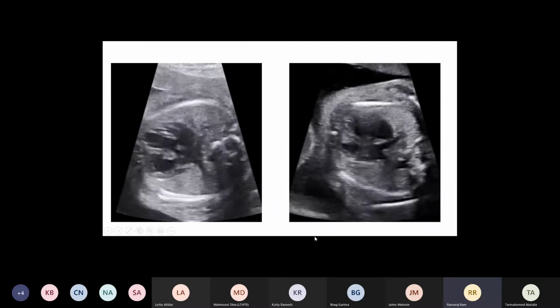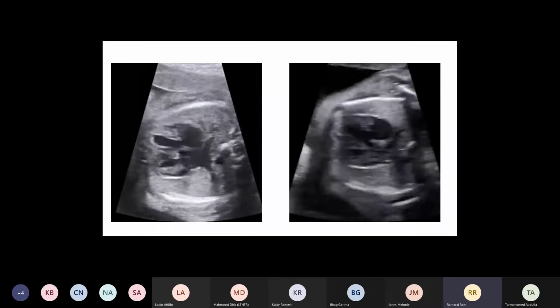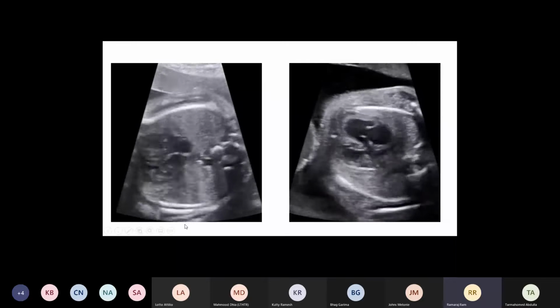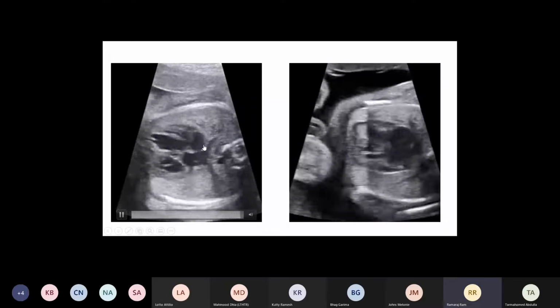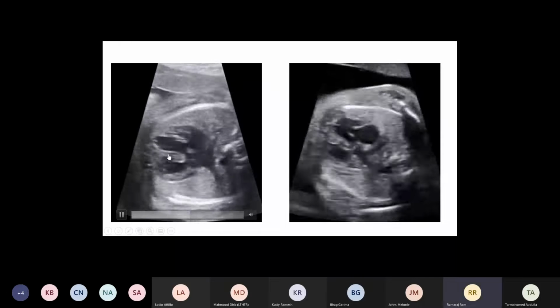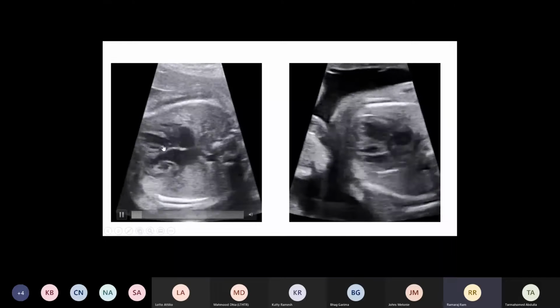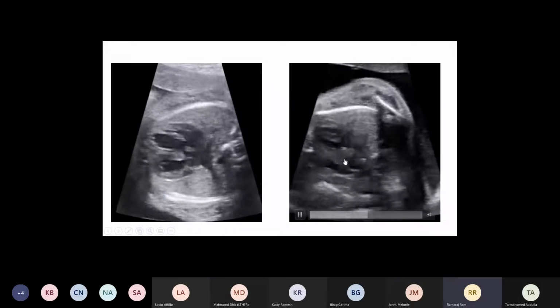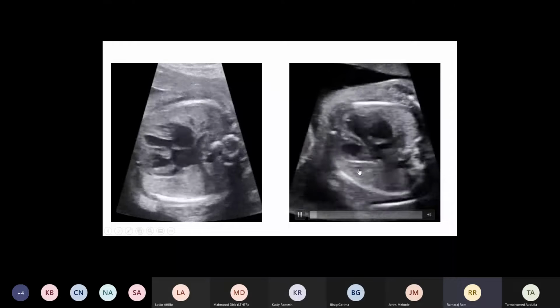So this one is an example I'm sure you can appreciate here. Your posterior pulmonic atrium, with the pulmonary vein connection, is connecting to your posterior right ventricle morphologically, and your anterior systemic atrium is connected to the left ventricle. And on the right side of the picture, if you look at the outflow tract, the left ventricle is giving rise to the pulmonary artery, and your right ventricle is giving rise to a parallel vessel, the aorta.